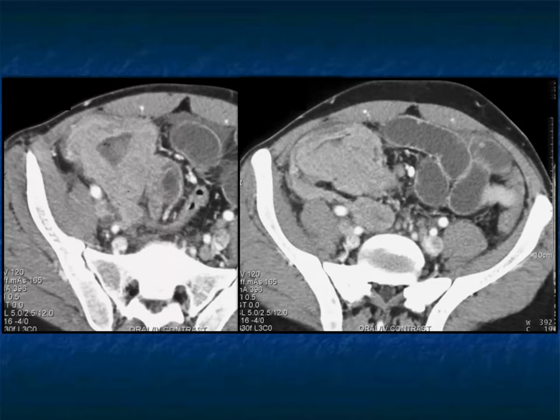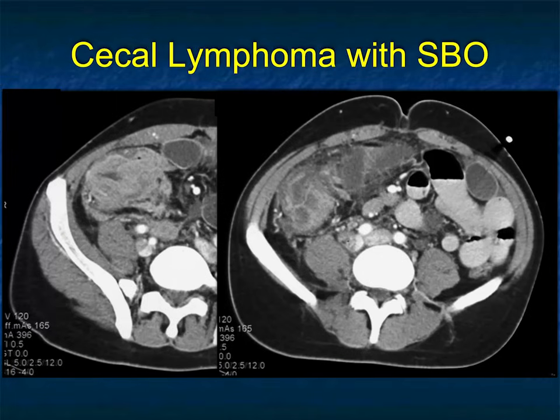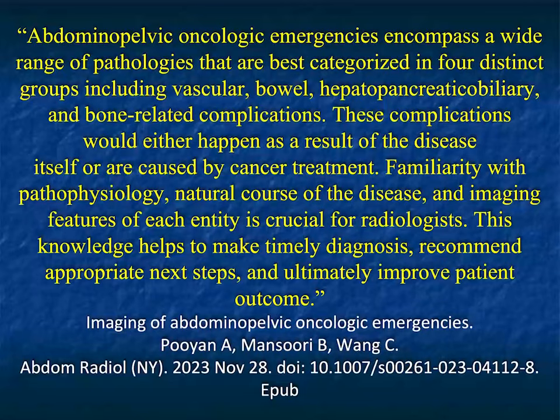So when you see something that involves cecum and terminal ileum, yes, you could say colon cancer, but when it's very bulky, think about lymphoma. That's a good possibility. And when you scanned upward, you saw lots of nodes in the peripancreatic region, in the paraortic region. You also saw splenic lesions. When you have a mass in the cecum, nodes and a splenic lesion, I'm going to think about lymphoma. And this was B-cell lymphoma presenting with bowel obstruction. But again, the tumor wasn't in the bowel itself, though it did involve the distal bowel. It was really the cecal component that was the big problem.